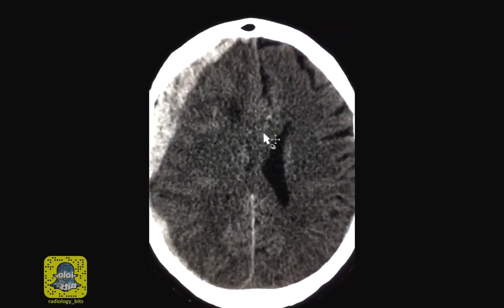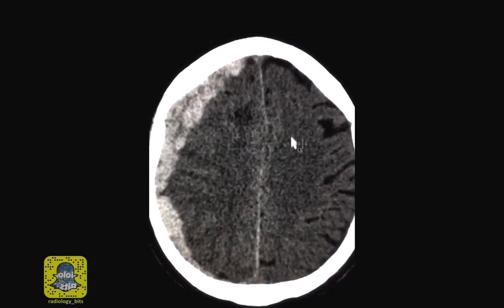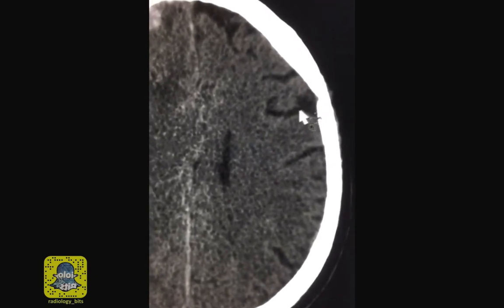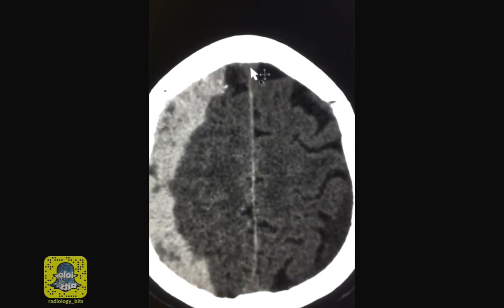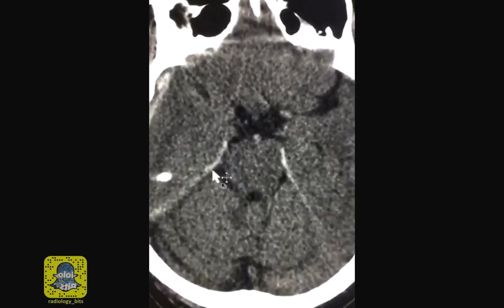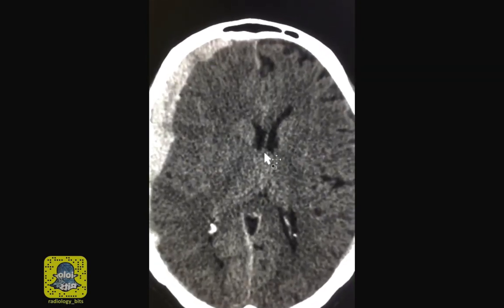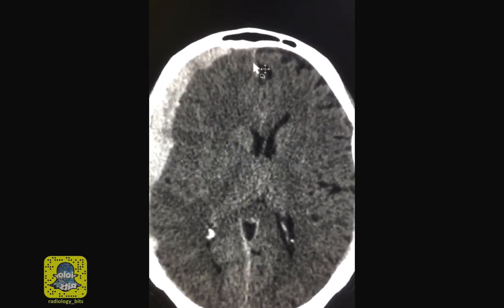Now let's revise what we talked about today. We learned that on a CT scan, gray matter is white and white matter is gray. We also learned about gyri and the dark separating CSF-filled sulci. We talked about the midline falx and the tentorial membrane that separates the supra from the infratentorial brain. We also knew about something called the Septum Pellucidum, another midline structure that, if you know it with the falx, could help you measure the midline shift. We talked about assessing sutures on bone window.